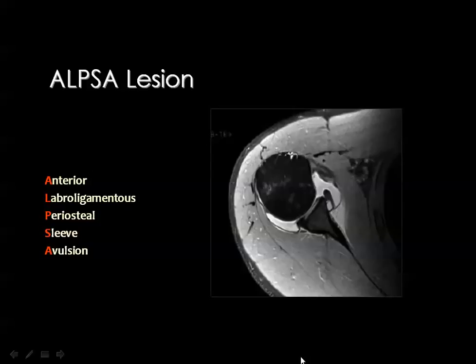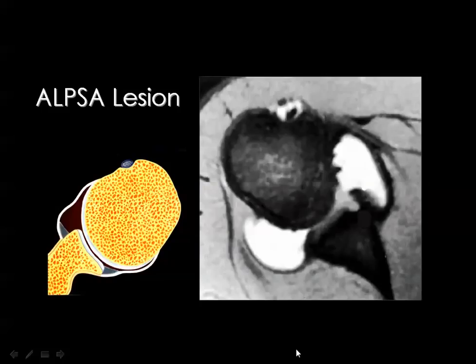Of course, you may appreciate that these lesions are difficult to be evaluated without the help of MR arthrogram. Also, if you see this appearance, you consider ALPSA as well.